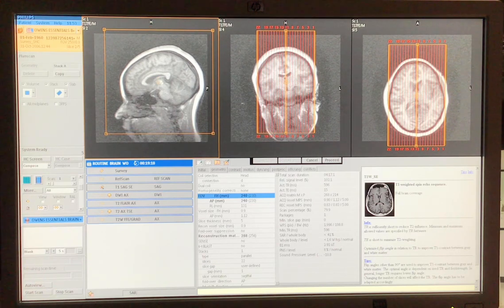But it's just the fact that you want your field of view to be hung up for the radiologist where their eyeballs are going to go right in the center of where they're looking at, right? And in this particular patient, this patient's head is pretty well straight in this plane.